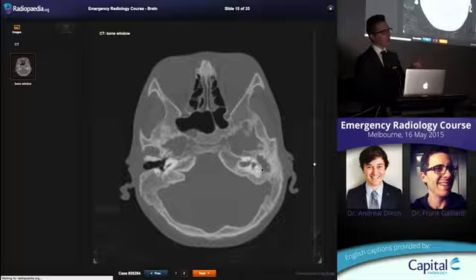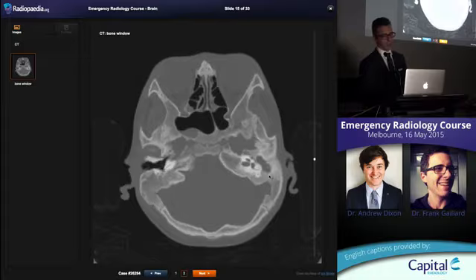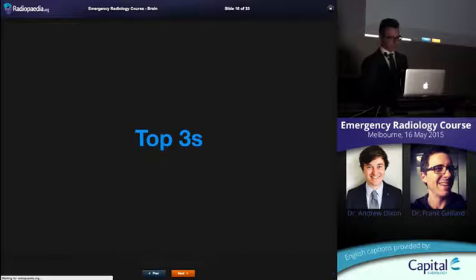And in this case, when you have an abscess that's near the skull somewhere, either frontal lobes inferiorly, inferior temporal lobe, or in this case posterior fossa, look at the skull base. That'll give you a great clue of where the infection came from. It can be hematogenous, but it's often direct extension from sinus disease. And here we have mastoiditis in this chap that's extended through cortical vein and into the cerebellum and caused a massive abscess. So, in the interest of trying to draw your attention to the really important ones, these are the top threes.